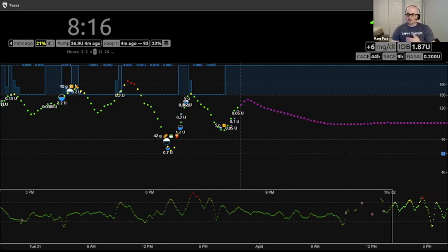You'll also notice very quickly, especially with Loop, but you can also use other tools to log these, even straight up in Nightscout, you can see boluses and carb entries. You'll see that the boluses are blue half circles, the bottom half. And the top half of the circle is white, which is carbs. If you were manually entering things in Nightscout, let's say you didn't have Loop and you wanted a tool to log all the stuff going on, like carbs and boluses, you could choose certain events that would make one circle with the top half white and the bottom half blue. With Loop, they're always separated because they're independent entries. They don't have to be done together.